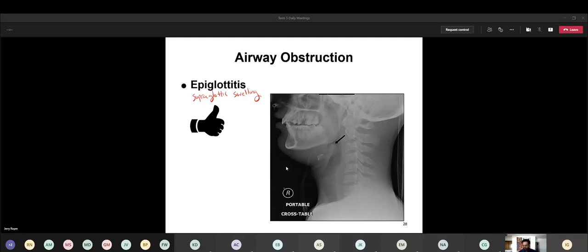So while we're looking at this film here, notice how your nasal cannula shows up pretty clearly. So there's the drawstring, what would you call it? The adjustment to make it tighter or slacker underneath the chin. And then there's the cannula itself. I don't know how old this child is, but just by looking at the overall features, it's clearly a child.